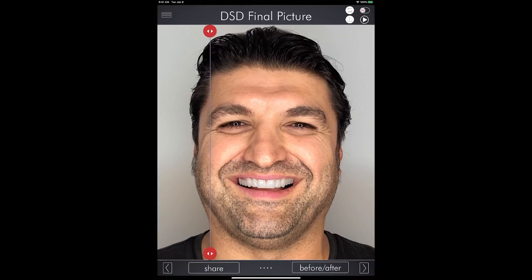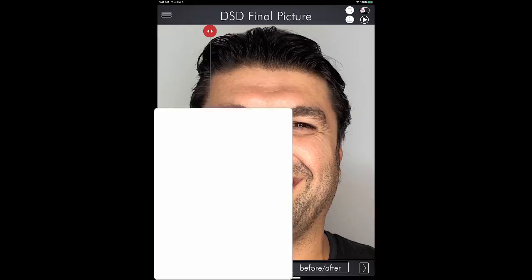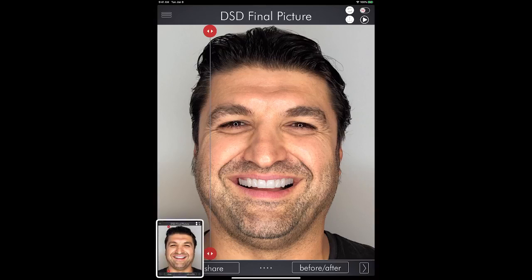So you cannot go with a super round, super harmonic smile because it's different. Let me take a screenshot. It's a different perspective of the smile.